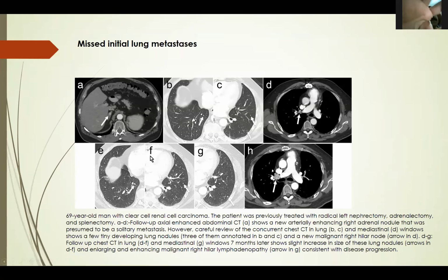And the patient underwent right adrenalectomy. So this patient is now on lifelong adrenal hormone replacement. On the follow-up, we can see the lung nodules increasing and the right hilar node increasing. Had they known that, maybe the treatment would have been systemic chemotherapy rather than an adrenalectomy for this patient. Those are the real world implications of what we say and what we don't say.